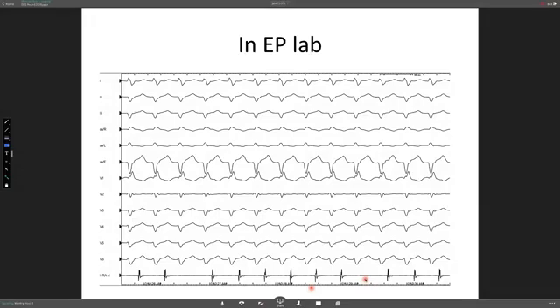I don't think we've seen it in the 12-lead EKG. Khalid brought it, but in the telemetry, what I do is you go from here and you go up. So this atrial activity, you will capture it at some point in one of the leads. And if you look at this T wave here, there is a little notch there. You see that? So that's the P wave, and this is the P wave. And here, where there's no atrial activity, you see that the notch is gone. You see this notch, you see the notch everywhere, and you can tell in this beat here, the notch is gone.